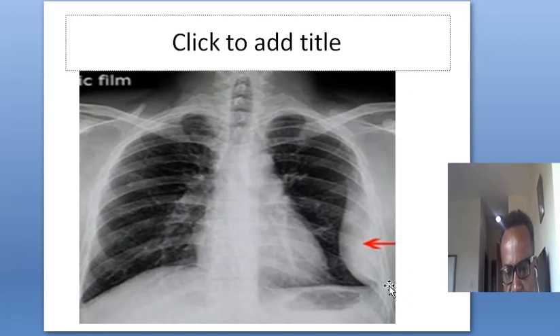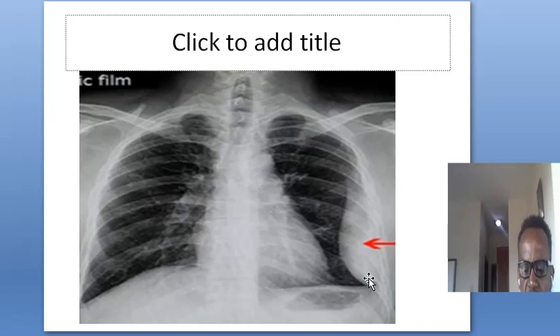This is a special type of pleural fluid collection where there is localization. Under normal conditions, fluid is found in the lower part, and the upper part will be the lung, as we see in the picture above. But here, because of localization, the fluid will be there.